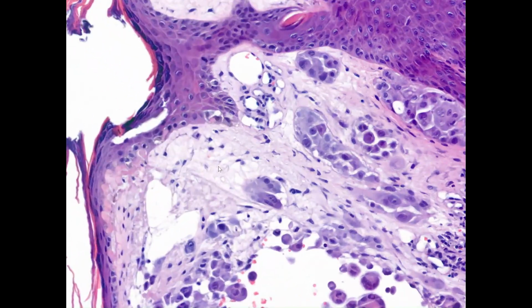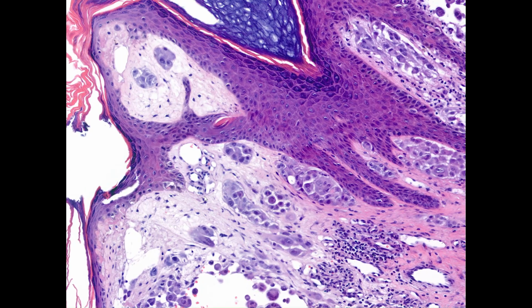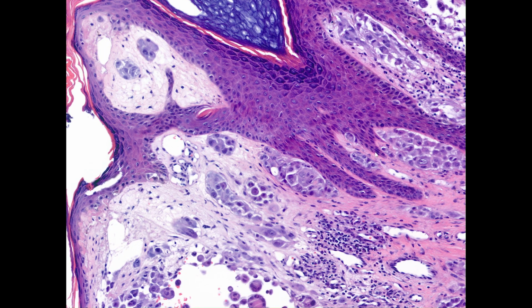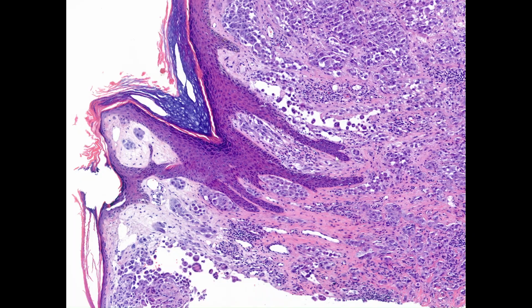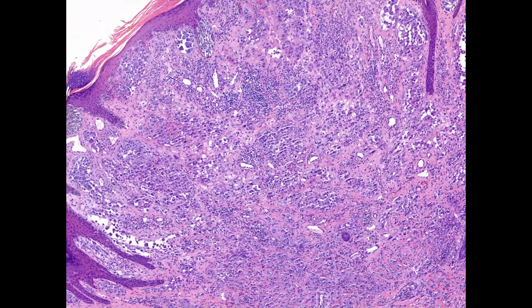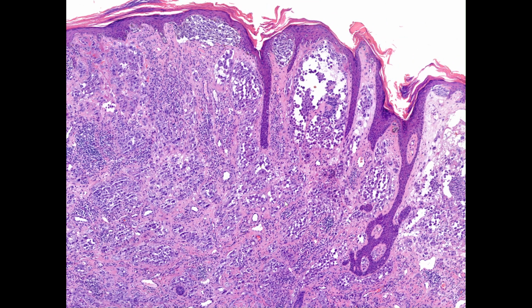And it's that combination of edema, fibrin, and crumbling of nests that morphologically correlates with the consequences of CDKN2A inactivation or loss. And so right away we're concerned that this is a partial transformation situation, meaning that this is a two-step tumor. It was initiated by gene fusion, and then subsequently there was an inactivation of CDKN2A. We're going to run through a couple of immunostains quickly.